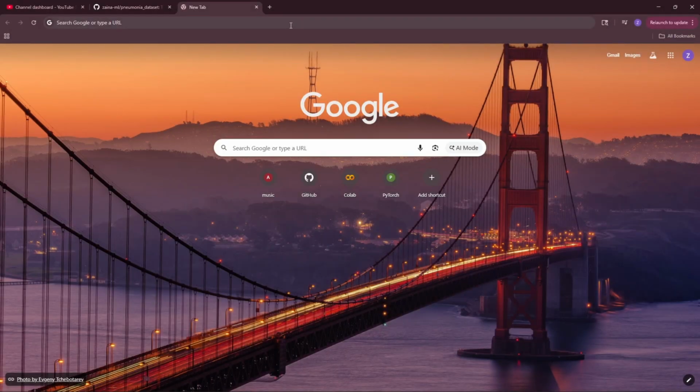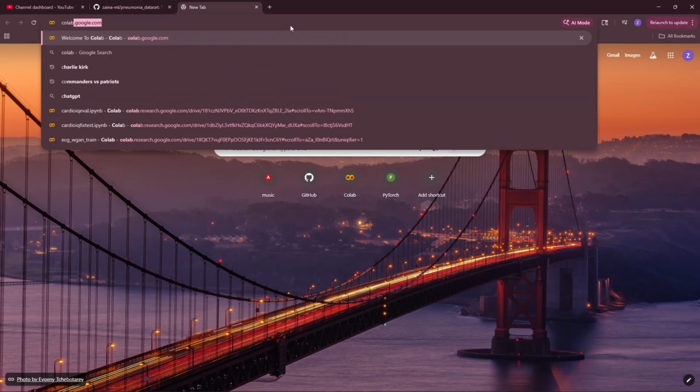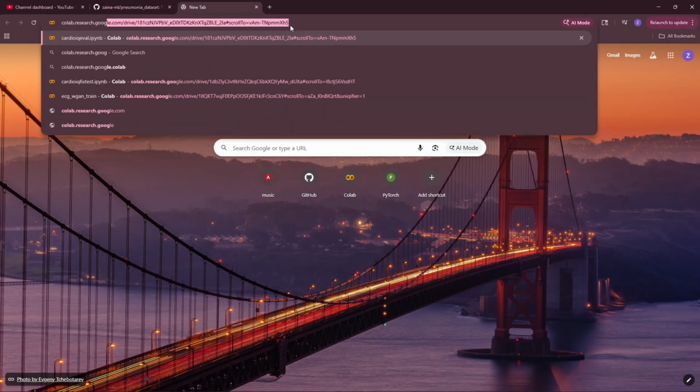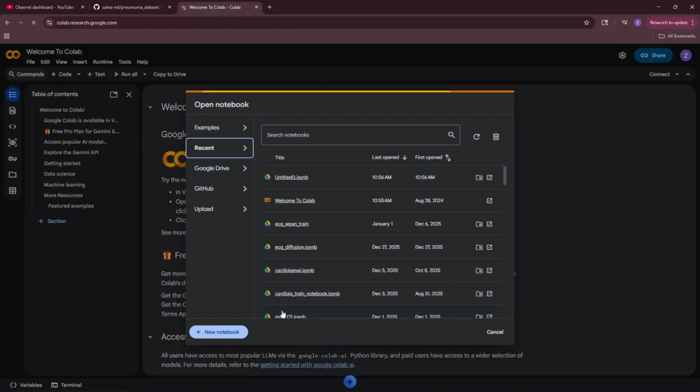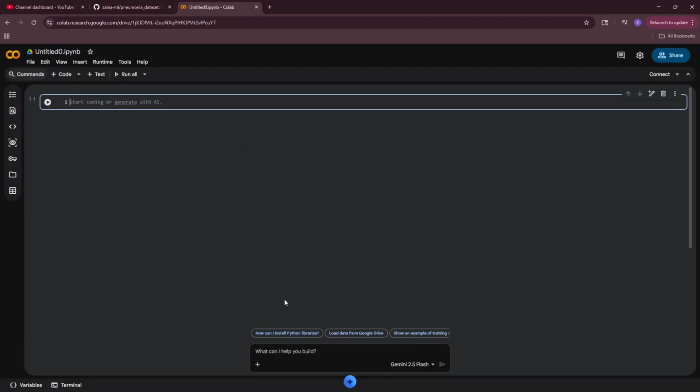Okay, here we are in Google Chrome, and let's get started. The first thing we need to do is go to colab.research.google.com. And this will take us right here where we can create a new notebook. This is where we'll write all our code and everything that we need to run our program. So this episode is going to be about downloading and setting up our data so we can train a model on it. So first thing, we'll name our notebook Pneumonia notebook.